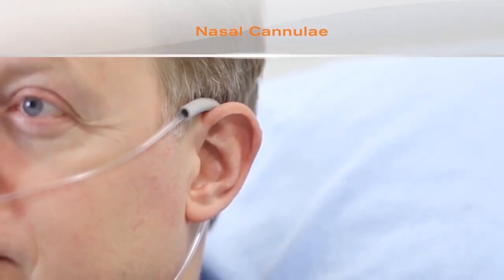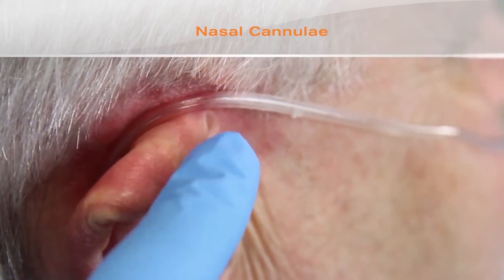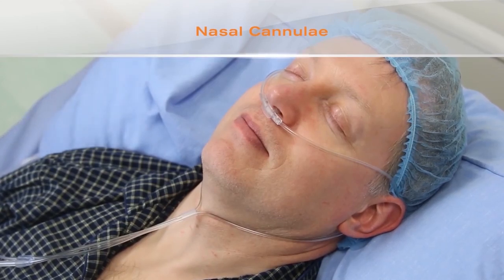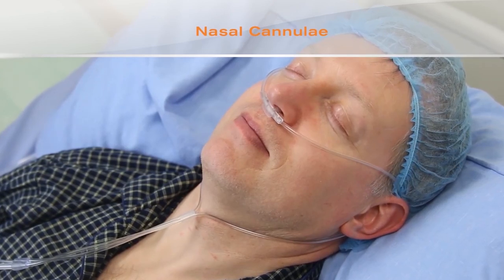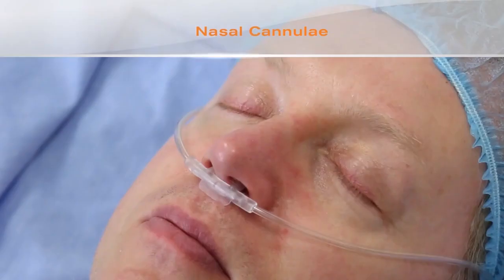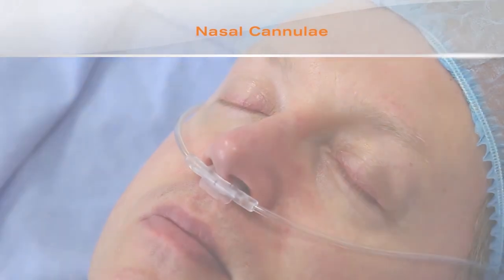Nasal cannulae can be supplied with ear guards, which can benefit long-term users of nasal cannulae by preventing sores on and around the ears. Nasal cannulae are also available which allow sampling of exhaled carbon dioxide in non-intubated patients, and the Intersurgical devices with this feature are called Sentry nasal cannulae. These devices are suitable for patients undergoing conscious sedation where respiratory depression needs to be monitored.